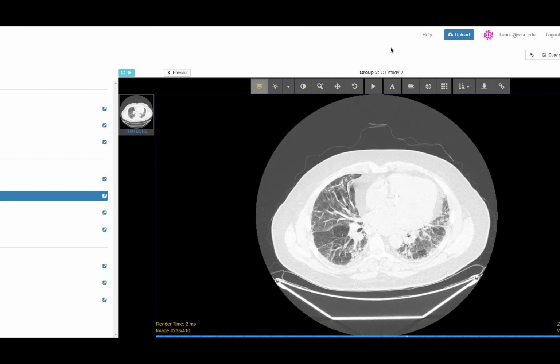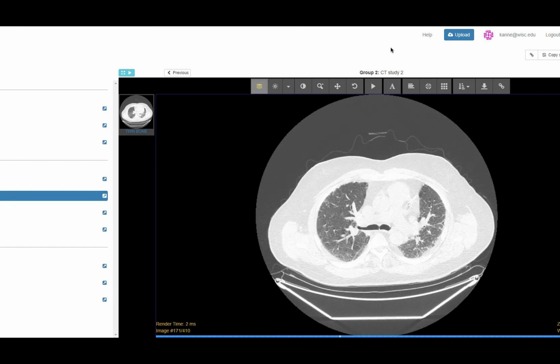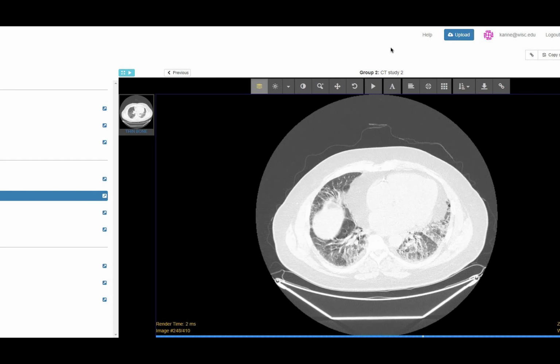So I don't know. I mean, I've seen fibrotic sarcoid, but it's almost always strikingly peribronchial, upper lobe. I've never seen one look like this. Curious. Yeah, I've never seen anything like that. Did she have a connective tissue disease workup?